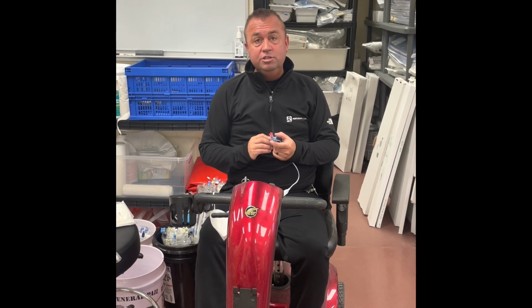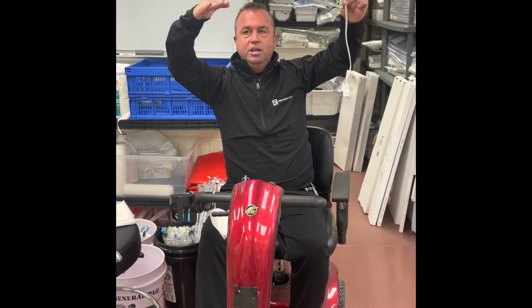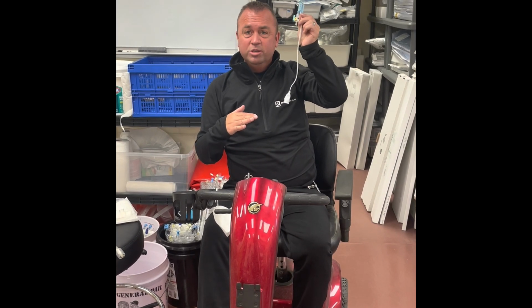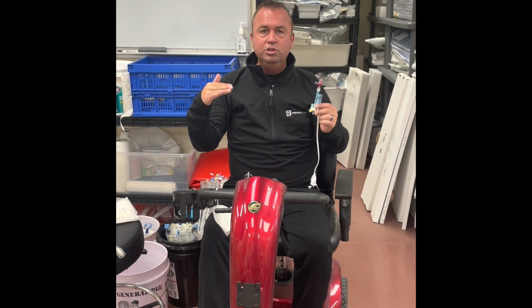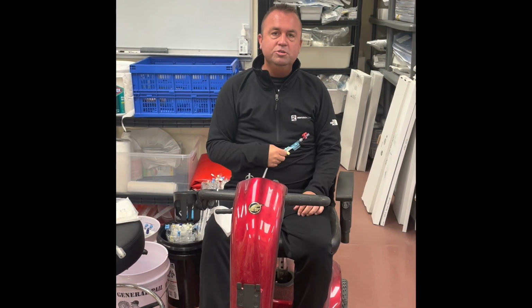It can also lead to problems if, say, the transducer is really high and we're taking mammary and then the patient's bed is lowered. Well, now it looks like the pressure is low, even though it's a false low, so we're treating a false low pressure when all we would have to do is bring the transducer down. So that's where and how the zeroing of the pressure transducers should occur.